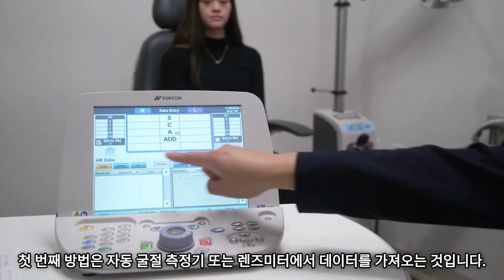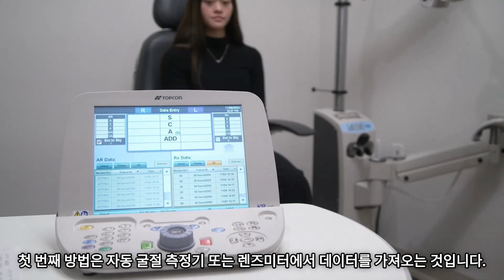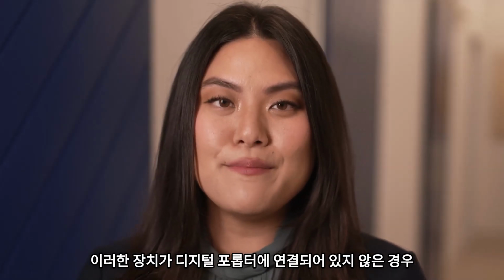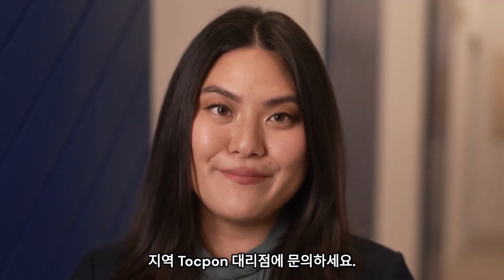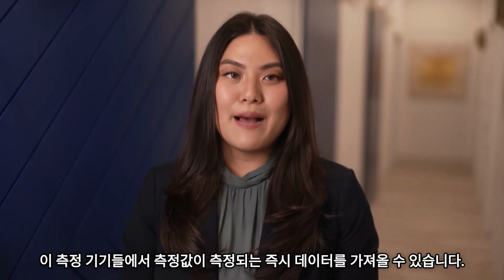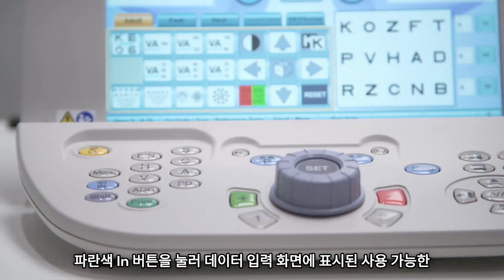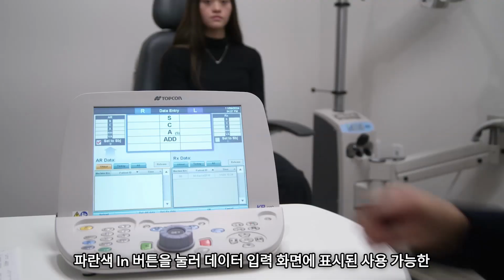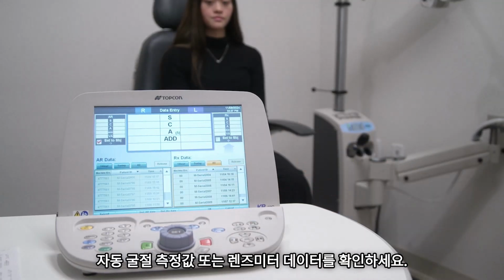The first method is to digitally import data from your autorefractor or computerized Lensmeter. Talk to your local TopCon supplier if you do not have these devices connected to your digital phoropter. As soon as measurements have been captured on these devices, the data is available for import. Press the blue In button to see the available autorefractor or Lensmeter data listed on the data input screen.